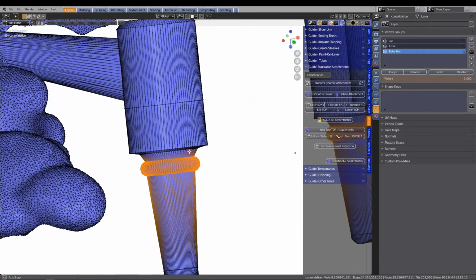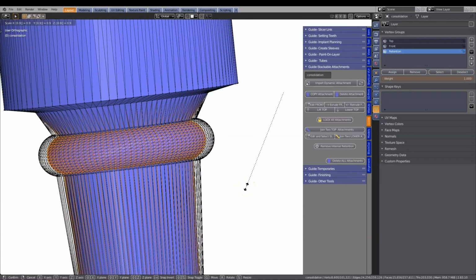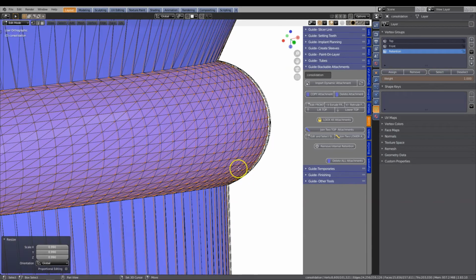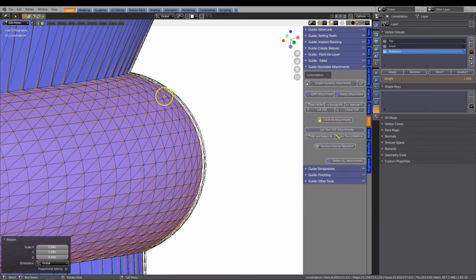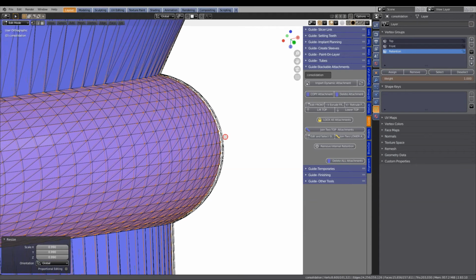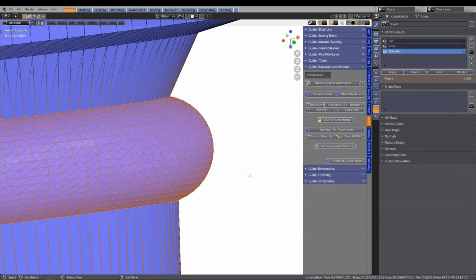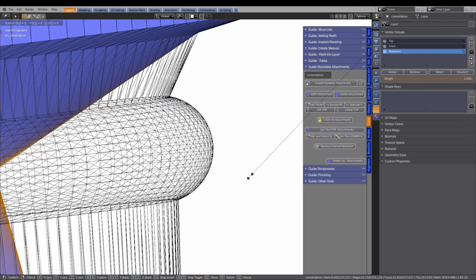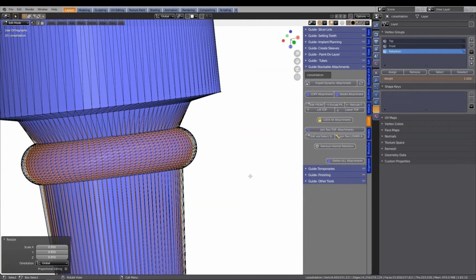Now I'm going to zoom in, and we're going to then click S to scale, and I'm going to put in 0.99, and this would then have scaled this ring by about a few microns. We can make a measurement, but it is a very, very small percentage. So going back, I'm going to click S to scale 0.95, and that's a little bit more. So I think it's about 5%.